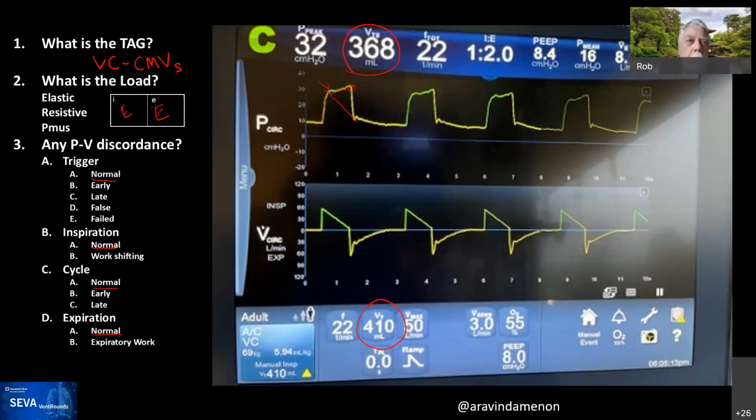Well, in pressure control, the ventilator controls pressure, but it's going to display exhaled tidal volume, and it has to correct for that, or inhaled tidal volume for that matter. So if the ventilator is measuring volume in any way and monitoring it or controlling it, it will generally correct to BTPS.